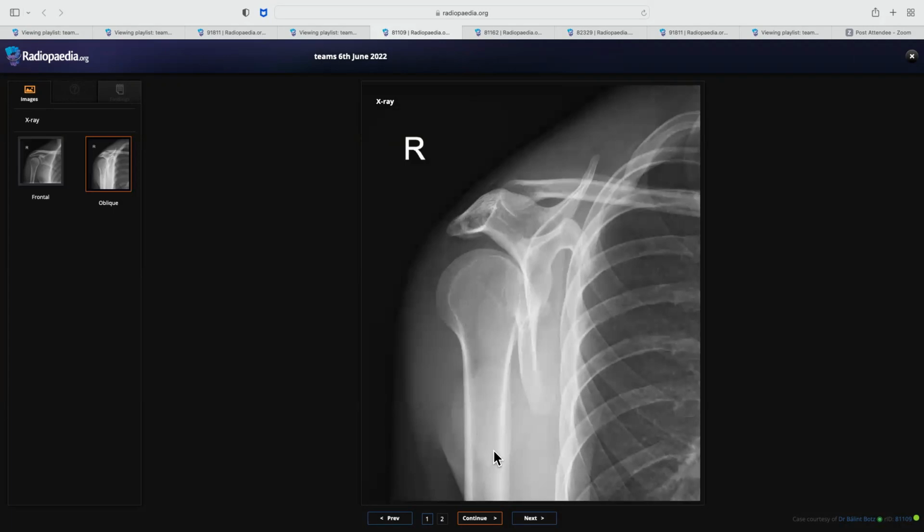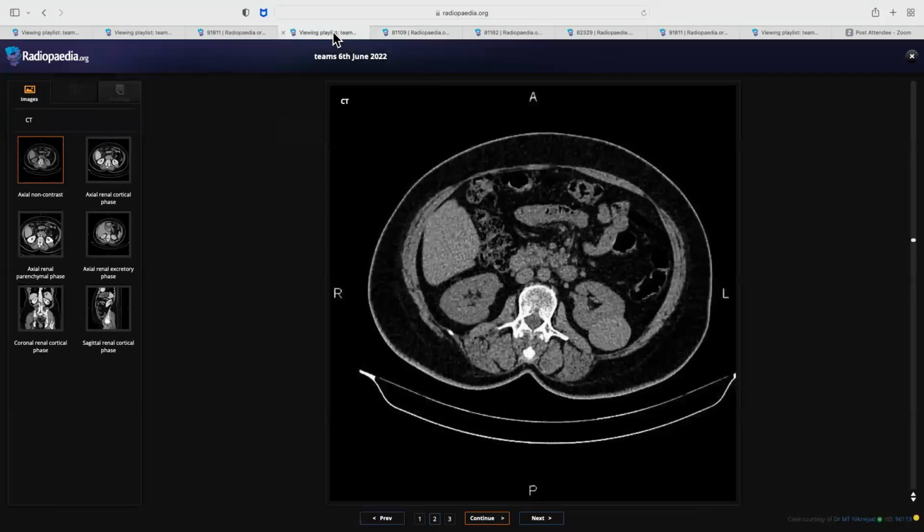Now when you say posterior dislocation, they can ask you about the signs of posterior dislocation, which you can read up. They are, of course, once you said light bulb sign and trough sign, there's a rim sign, but sometimes they do ask in detail about the rim sign and trough sign, especially if that's seen in that particular case. But here they are not seen.